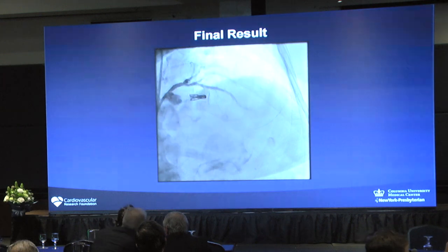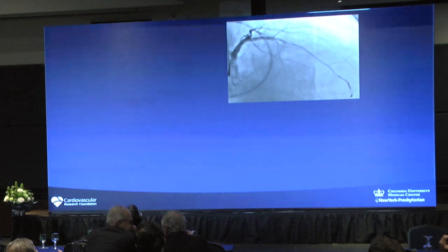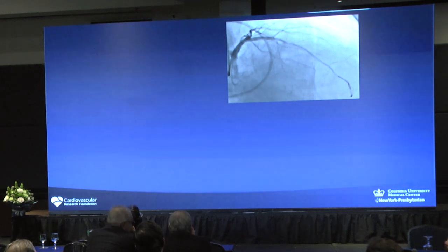Okay, this is a final. Okay, it's interesting that this movie worked. Okay, good. Okay, this is a different picture, and this is a different case.